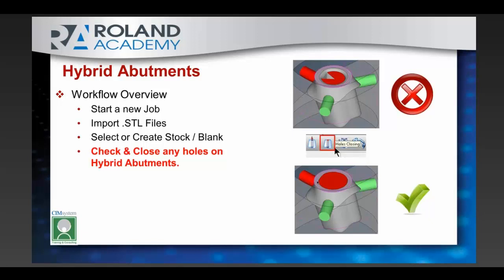The roughing operation, when it comes in initially with your larger tool, whether that be a 2 or a 3 millimeter tool, is going to rough out as much as it can before it steps down to a smaller tool to be able to finish that out.